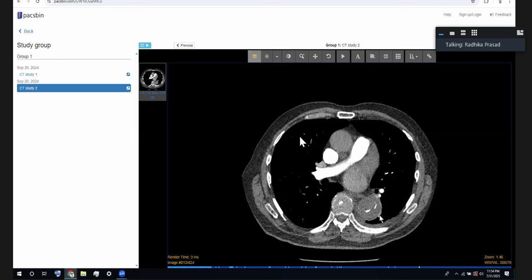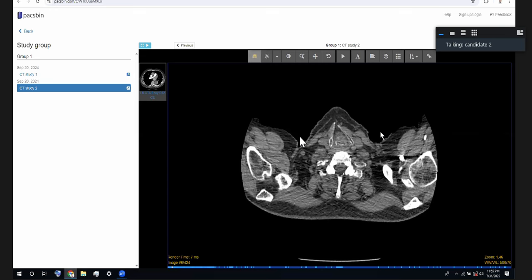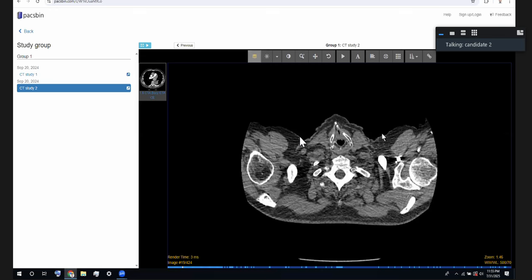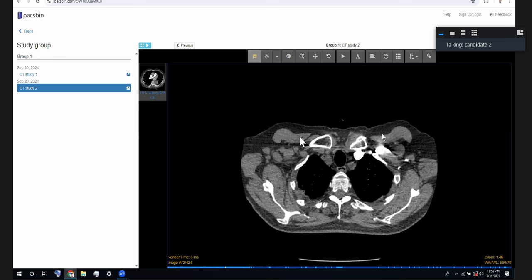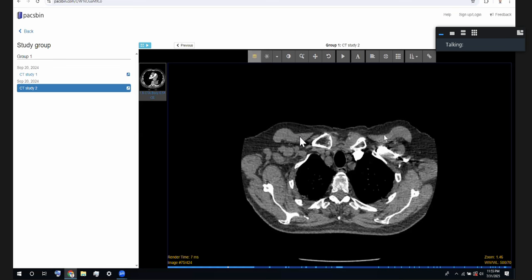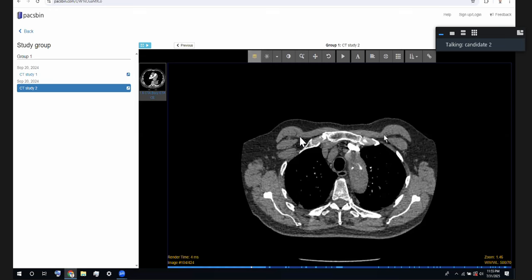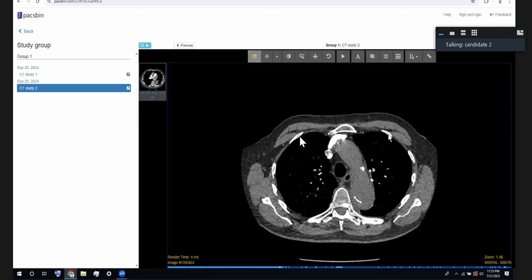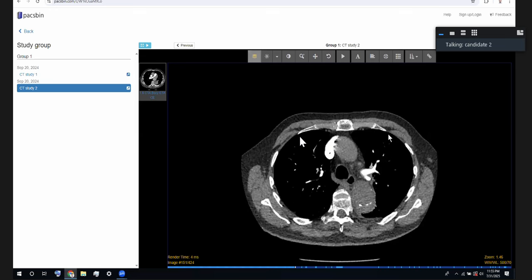Patient attends with chest pain. Seen by A&E staff, and they think it's a PE, so they ask for a CTPA. Okay. So provided is the CTPA study of a patient with chest pain. I'll just scroll through the entire stack before I comment. It's still loading a little.